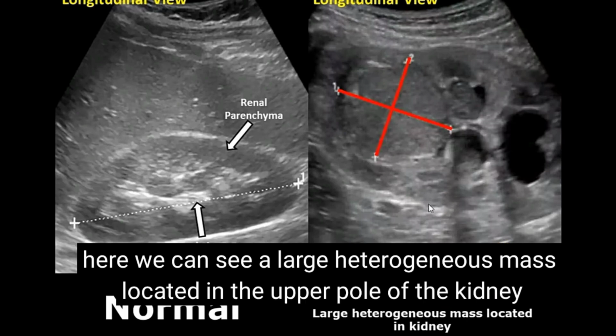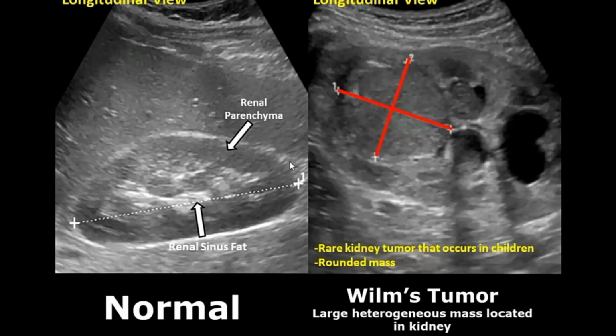Wilms tumor is a rare kidney disorder. Here we can see a large heterogeneous mass located in the upper pole of the kidney.